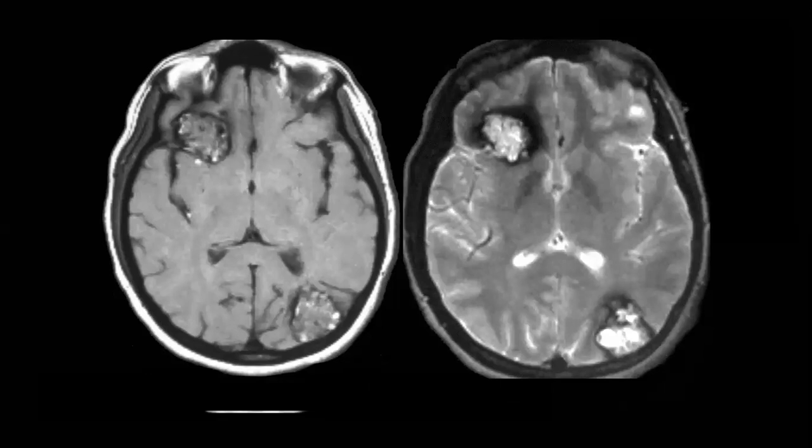Before, you can put any differential, but when you see this popcorn, if you like popcorn, with this hemosiderin appearance around this popcorn, think about cavernoma. They like it in the exam, and they will ask you what is the most sensitive sequence. The most sensitive sequence, they like it, SWI, as in the chat, SWI, yes. The SWI is very, very important in such a case, because you want to know how many lesions he has. Yeah, the T2 star, SWI, gradient, whatever.